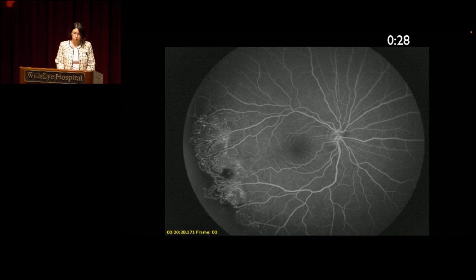We have a fluorescein angiogram at 28 seconds. It looks like the veins have been completely filled at this time frame. Our attention is drawn to this area of clear avascularity in the temporal retina, along with, at the border, these microaneurysmal telangiectatic changes to the vasculature, some loop formation, AV anastomosis here. There's some hypofluorescence corresponding to that white-red lesion we had at this time frame, might be due to blockage.